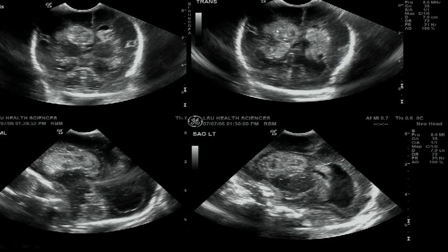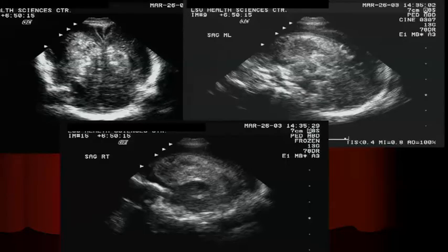61483. This patient right here has a right-sided grade 4 hemorrhage and a left-sided grade 3 hemorrhage. You see this, John? How thick that blood is? That made the ventricle big. This is grade 4 because it's out here in the brain parenchyma. Grade 3s and 4s are bad, poor prognosis. Grades 1 and 2 aren't that bad. And here it is again into the brain parenchyma.